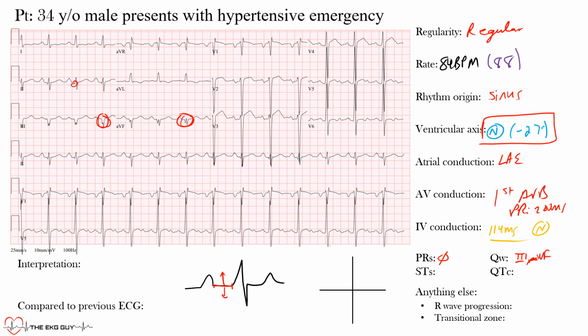And then if we look at the ST segment, the ST segment is this portion here. We're asking ourselves, is it depressed? Is this J point depressed or elevated? Well, you may see some here, per se. So some ST segment issues there, but not significant enough. Nothing that we would be concerned with regard to this. The patient actually did not have any ischemia. So we will get to that in a little bit, but there's a little bit of elevation, maybe some T-wave inversion there as well. Okay, so as we go through that, we're noticing that.